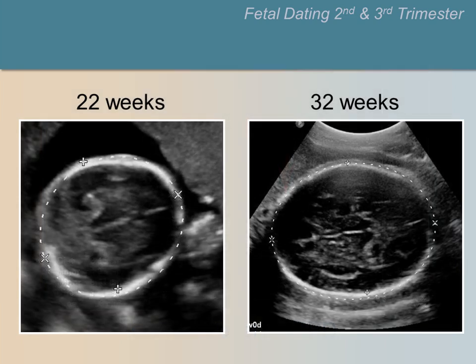The image on the left is a fetus at 22 weeks, and on the right, a fetus at 32 weeks. The cavum septum pellucidum looks somewhat different in both images. We have outlined the CSP in both images to make it more obvious. On the left, it looks more like a black box than 3 white lines. Both images are accurate levels for BPD.